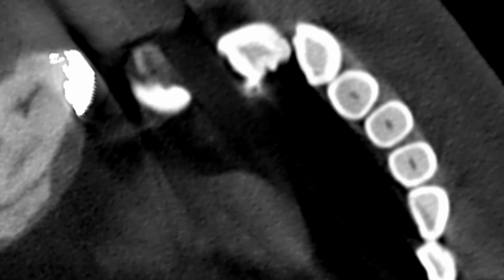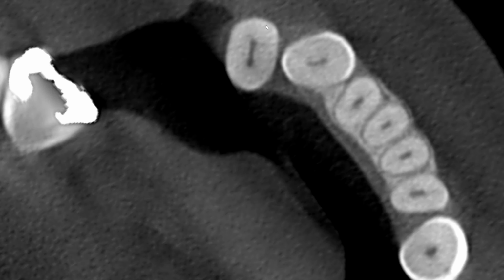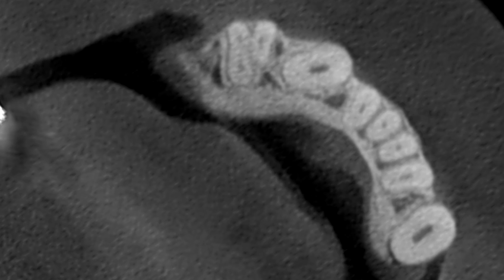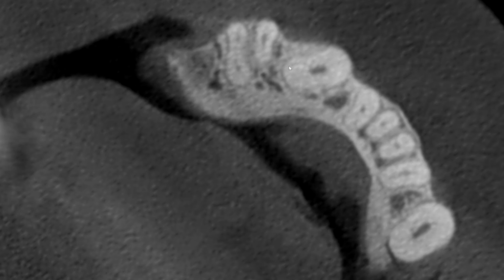So starting with the crown, moving apically. Right here, we see the loss of the enamel layer, meaning we're at about the level of CJ, and moving toward the apex. Still single canal. And right here, what do you see? We are starting to see bifurcation of the root, one mesial root, and then the distal root. The distal root is a lot longer buccolingually than the mesial root.